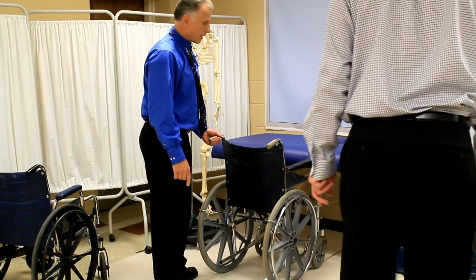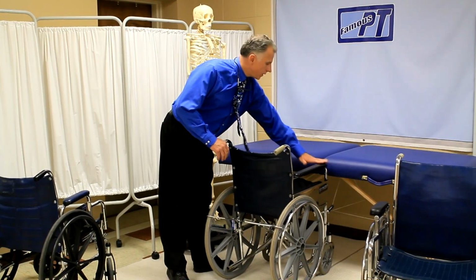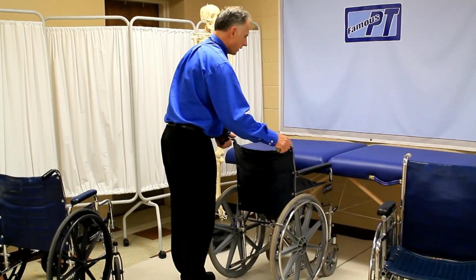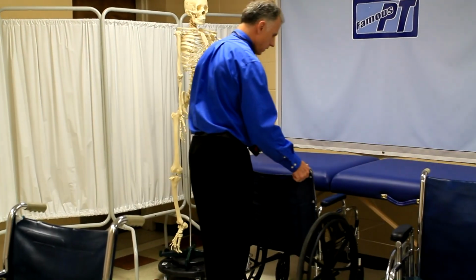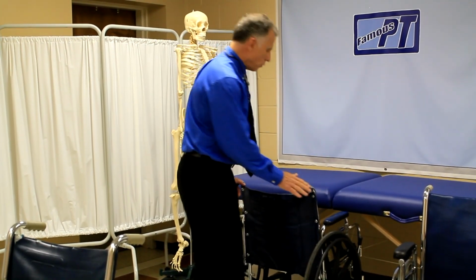So if you see right now, if there's a table and we're eating, you cannot get very close because bang, they hit. However, when you have this, you can get in closer.